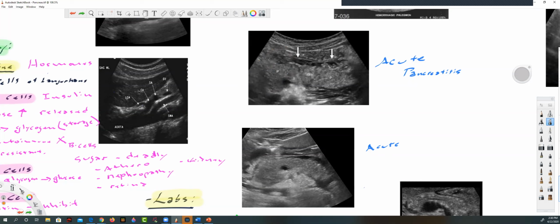And I was all concerned. I thought he had cancer and all this stuff. He did have jaundice, because bile can't get out of the liver with a large tumor like that. He had pancreatitis because pancreatic juice can't get out of the pancreas with a large mass like that. But for him, it wasn't a mass as much as it was focal pancreatitis. This person on this image here has diffuse pancreatitis all the way down there. It's interesting how this pancreas doesn't dive down like they normally do. I can't explain that, but I can't always explain everything I see.